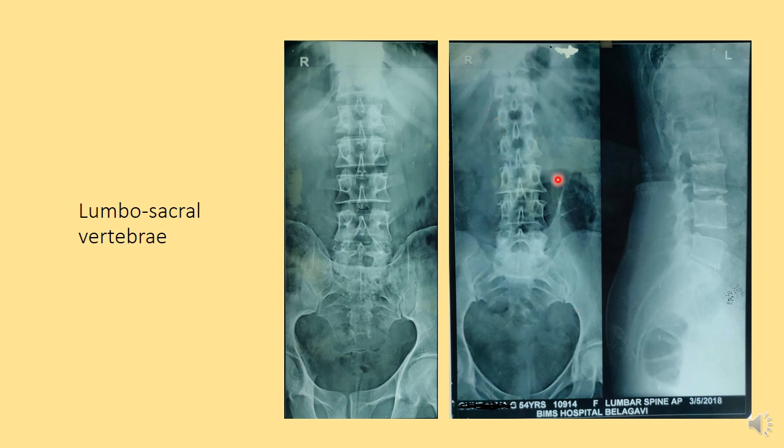This is the area for the psoas major muscle. You can see here, this is again psoas major, left and right, and this is the lateral view. You can see this is the concavity made by the sacrum. This is the upper end, and this is L5, L4, 3, 2 and L1. This is the lateral view of the lumbosacral region.